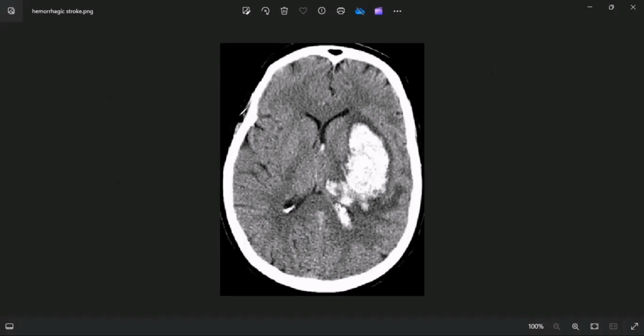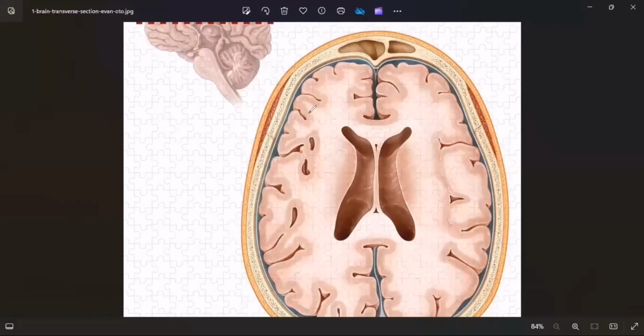So now, how do you identify a contrast from a non-contrast? Do you see these spaces? Can you picture these spaces? You see these spaces are dark, right? Do you see that? Yes, Doc. Look at this space. They are actually the spaces between the... look at this. You see those dark spaces, these are they. Do you see that?